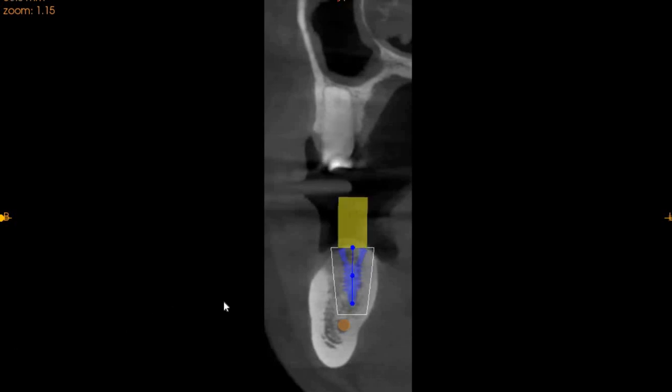We've kept a 6 implant diameter for maximum engagement in this area. We still have sufficient bone on the buccal and the lingual aspect, and because of the height, we've kept an 8.5 height of the implant. Now, the approximate height in this region from the crest of the ridge to the inferior alveolar nerve is approximately 12 millimeters, and the width in this region is approximately 8.2 millimeters.